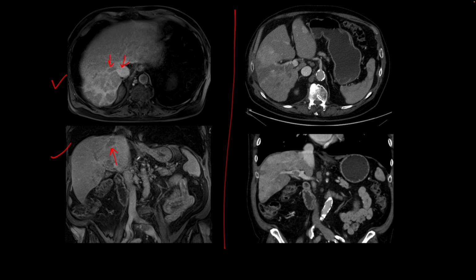And so whenever you are evaluating a CT scan or the MRI of the abdomen in a patient with HCC, make sure you identify the borders of the tumor correctly, especially where it abuts a branch of the bile duct, portal vein, or the hepatic vein, because this tumor is notorious for growing into or invading the surrounding structures. And so we see the same finding here. Main portal vein is involved on the CT scan post-contrast in another patient, and we see that finding here as well, that the tumor is growing into the main portal vein.